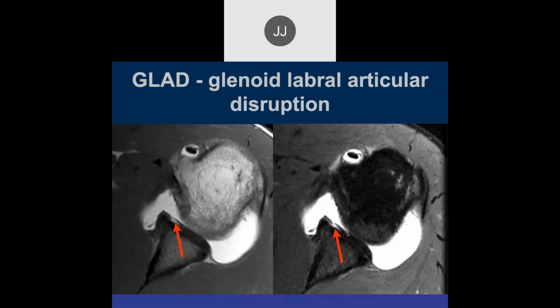in that recess down below? Down here? Yeah, I think so. And I think there is also some periosteal thickening and some displacement of the labrum here too. And it always is worse before reduction. That's why it leaves the stuff behind. You've got to look for it.